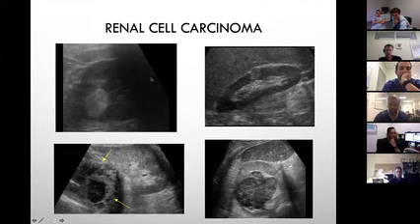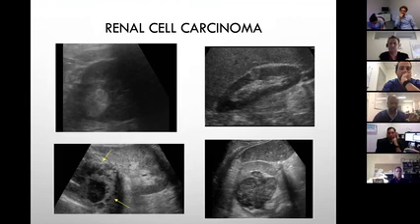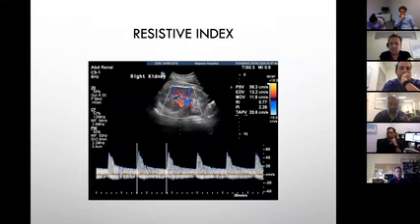The renal cell carcinoma could be in any form, could be lytic lesions, echogenic lesions, this kind of heterogeneous lesion. Unfortunately, from our point of view, from the ED side of it, any solid mass that we see, we escalate it up. Cystic mass, if it's a simple cyst with one septation, I ignore it. Anything else, we escalate it up to look into it.